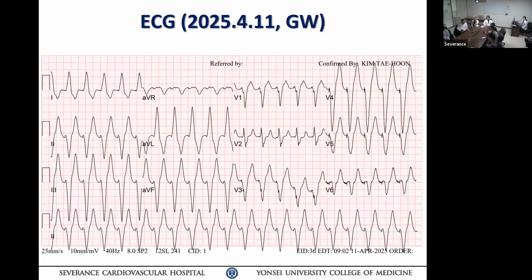So now 6 to 6. Can we see the answer? Okay, let's take a look.